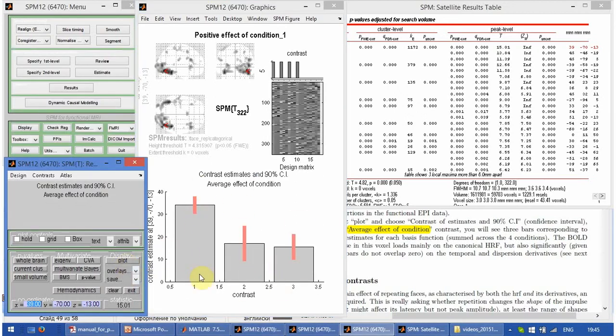As you can see, all these 3 look quite significant. That means that in total the hemodynamic response in this brain area to those conditions is a bit shorter and earlier and a bit more sharp than the canonical wave shape. This is for canonical HRF function. This is for the time derivative of this function and the dispersion derivative.